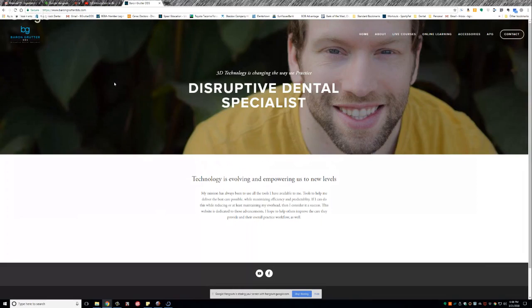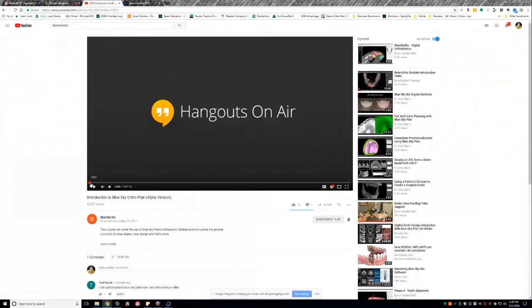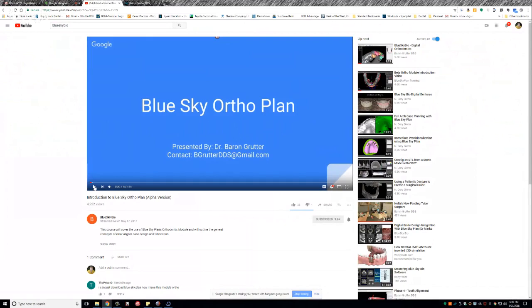So I'm bringing up the very first slide I have, which isn't really a slide. It's actually my website. The reason is that the last presentation I did on the ortho software was largely slide based. If anyone wants to go back and see a little about that, it's on the Blue Sky Bio YouTube channel, and you can find it right here. It talks a lot about aligners in general, why to do it, what the advantages are, and some of the perks of BlueSkyPlan.